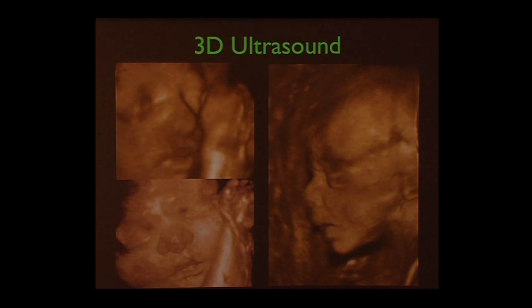Of course, we do 3D of babies. It has some usefulness, I think more for marketing than anything, but it does have some usefulness. We don't do very much of it, but I've seen advertisements for a Valentine's Day special, where 2 people can come in and get images of your baby for your album. That's not a very good use of ultrasound.